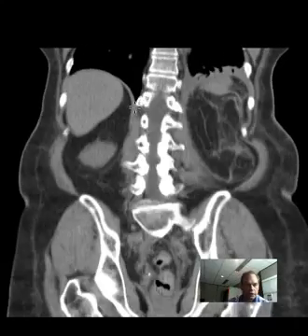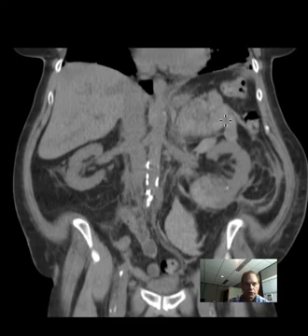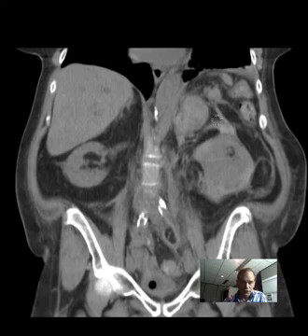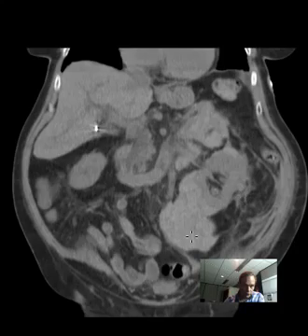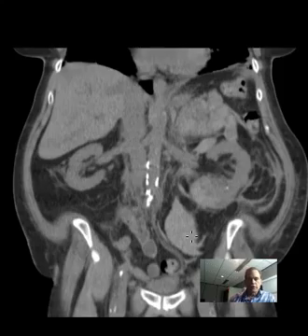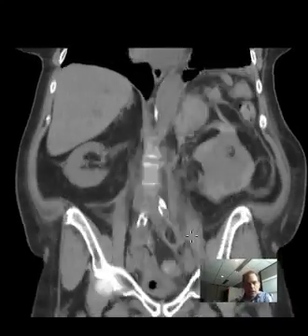Oh sweet, that worked well. I didn't know I could even do that. This shows you that hematoma very nicely. Again, in the perirenal space, and look what it's done to the perirenal space. Even though it's a very small space, it varies from patient to patient, but even in this case you can see it's sitting here quietly. You'd never think there was much to that anatomy, but you blow up an adrenal gland like this, and sure enough you get all this stranding and high attenuation and enlargement, and whoa, we got a big part of the hematoma down here too. So this is an unusually large, actively bleeding adrenal gland hemorrhage.